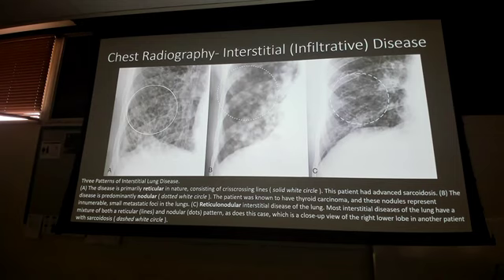It's all radiopaque. So if you look down here, my nodules are, again, all sarcoidosis stuff, but it can also be metastatic disease in the lungs as well. So these can be metastases as well. So it's the radiopaque areas. Because a normal chest x-ray should be fairly radiolucent except for my lung markings, my linear vasculature, those tree branches that are more radiopaque. There are no radiopaque nodules or circular areas in the lungs, especially down in the lower third.